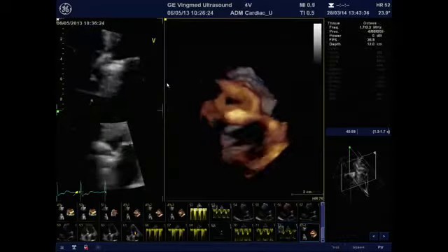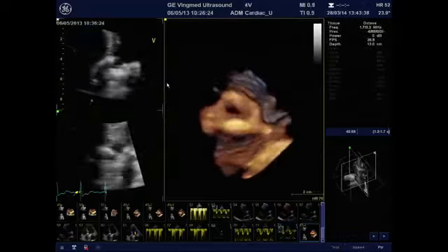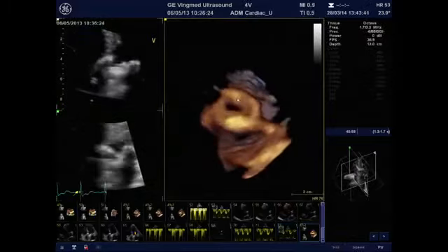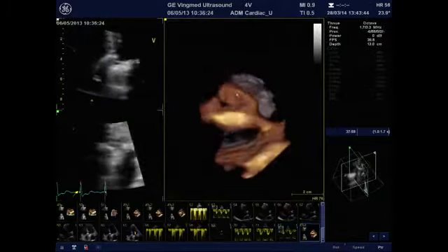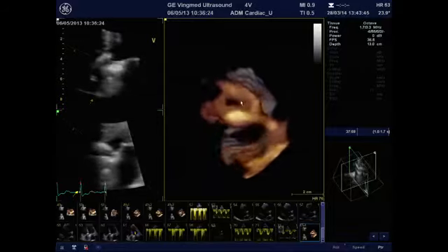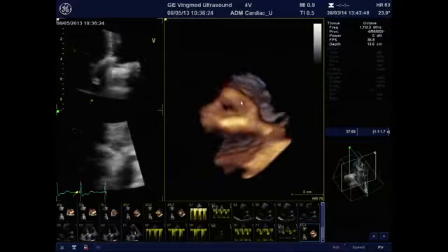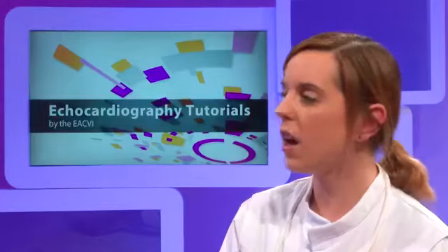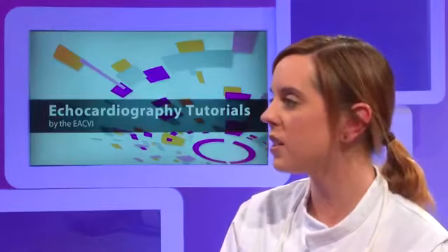In that case, when we use 3D imaging, we can clearly see over here that there was pannus just above the prosthesis, and that patient was referred to surgery, and the surgeon confirmed that diagnosis. So now I'm going to show you the second case.